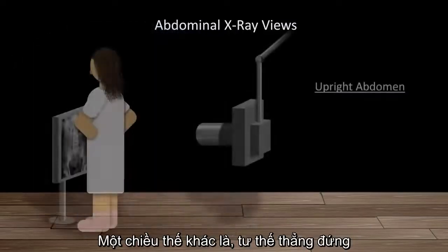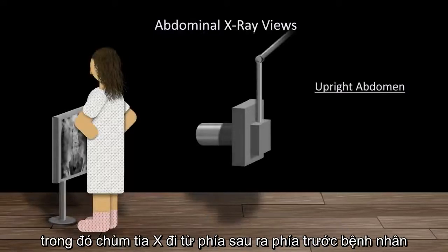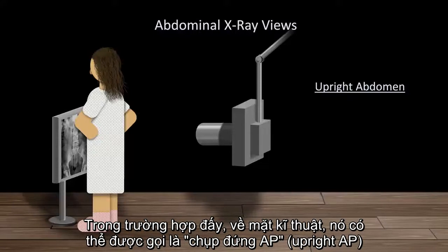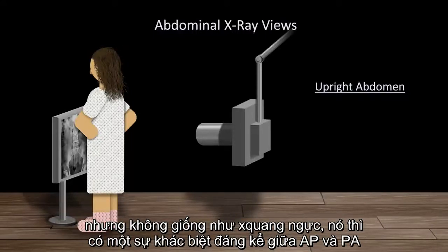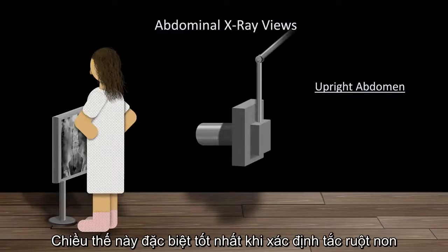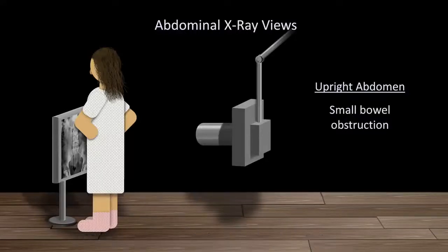Another view is the upright abdominal view. What's shown here is technically an upright PA view, in which the X-ray beam travels from the posterior to the anterior of the patient, though this view can also be taken with the patient facing forward, in which case it could technically be referred to as an upright AP view. But unlike with chest films, in which there is a significant difference between the AP and PA views, there is not with upright abdominal films. This view is best specifically for identifying small bowel obstructions, which is really its only major indication.